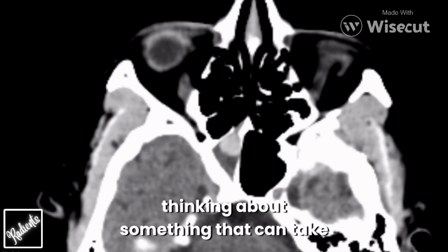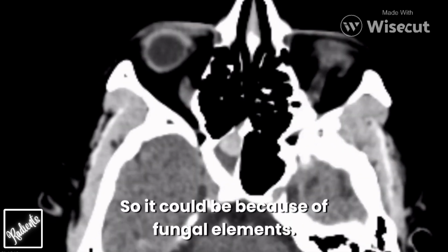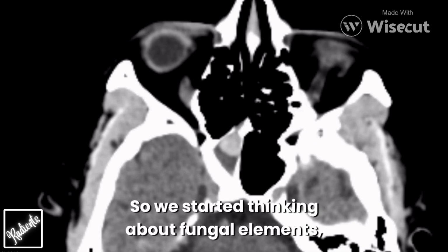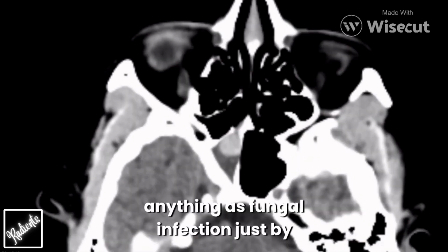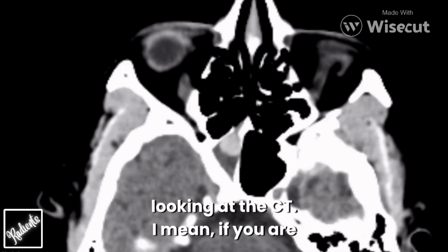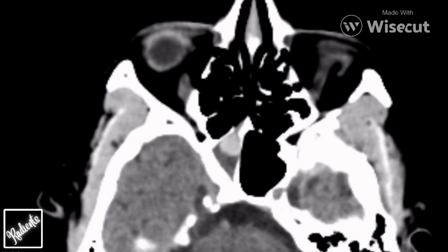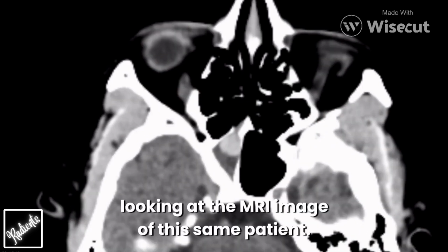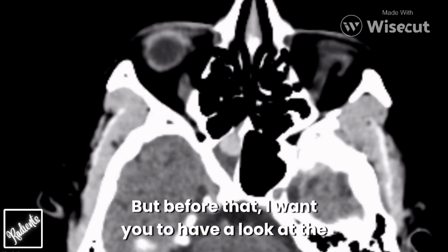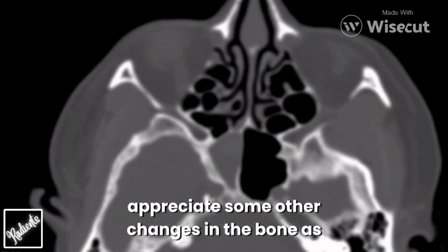You should be thinking about something that can take a round shape and can be hyperdense on CT scan. So it could be because of fungal elements. So we started thinking about fungal elements, of course, but you cannot stamp anything as fungal infection just by looking at the CT. If you're talking about a fungal ball here, we need the help of another imaging modality, and that is MRI. And thankfully we have that at hand right now, and we will also be looking at the MRI image of this same patient. But before that, I want you to have a look at the bone window first, so that you can appreciate some other changes in the bone as well.